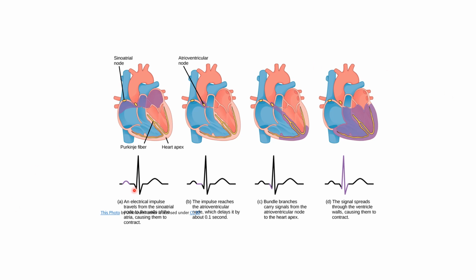Okay, that's about it. Normal sinus rhythm. There are other rhythms like ventricular tachycardia and ventricular fibrillation, but to get to know them, firstly we need to understand normal sinus rhythm. Then we can identify what abnormal changes appear in the ECG. I hope it helped.